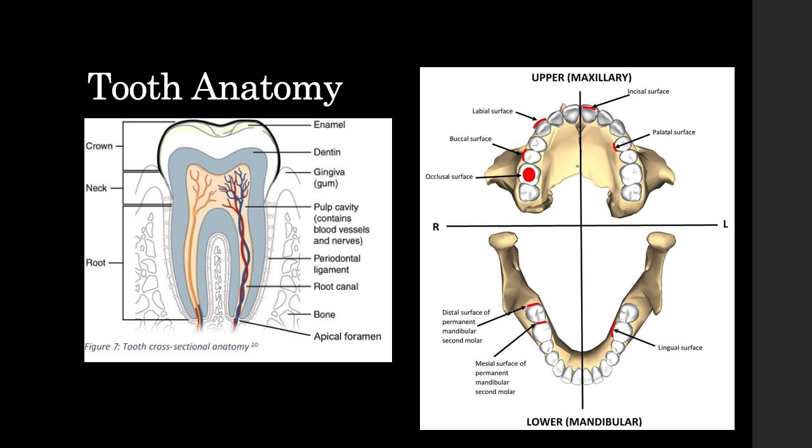On the left here, this is a picture of general tooth anatomy. This is not something you'll see all of on radiography, but as we saw earlier on the OPG, the pulp is actually quite visible. On dental radiographs, you can see the dentin has a slightly lower shadow than the enamel, which is quite calcium bright, and then the pulp itself is quite hypodense, so you can really make out that neurovascular architecture.